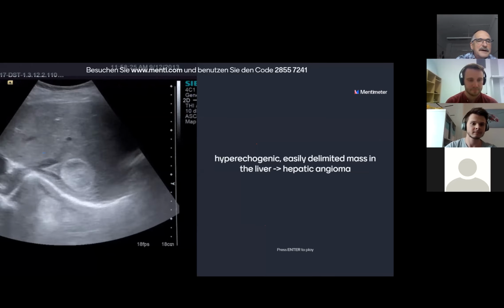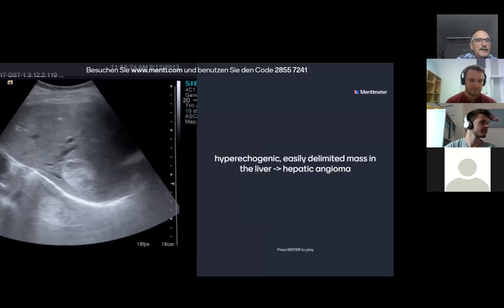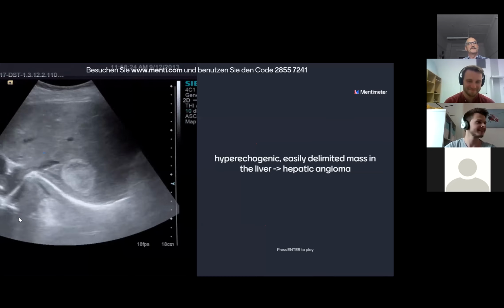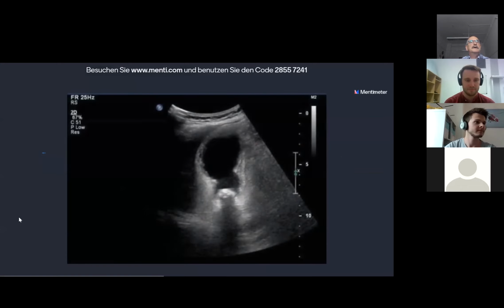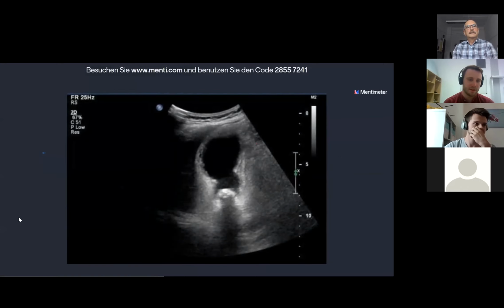And what you can see here, in our last webinar Professor Yu Hong spoke about the mirror artifact, and that is very nice. On the other side of the diaphragm, you can see the mirror artifact of a liver vein and the lesion in the liver. That's perfect. Thank you. Everyone was right. Your next patient is a 35-year-old female, Caucasian ethnicity, with a BMI of 39. This is the ultrasound picture.